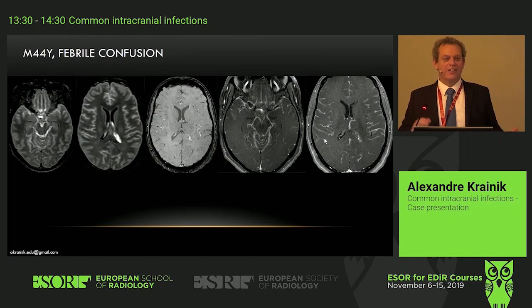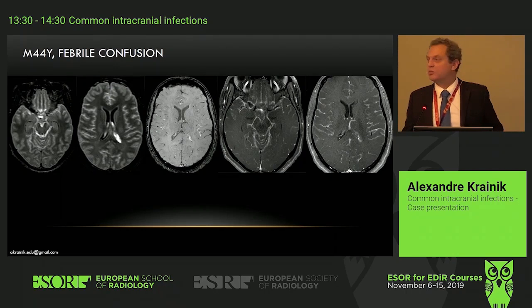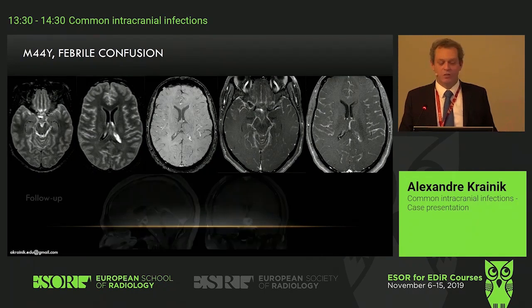is it patchy or leptomeningeal? Lepto, huh? We agree. There's a leptomeningeal reaction, quite diffuse, okay, convexity around the midbrain, and you see on FLAIR image this discrepancy between the dark signal of the ventricles and the very high signal of the subarachnoid space, okay? Well, using SWI, you don't see that much, and this is a leptomeningitis, but which one? Of which germ? It could be whatever, bacterial or viral or whatever.